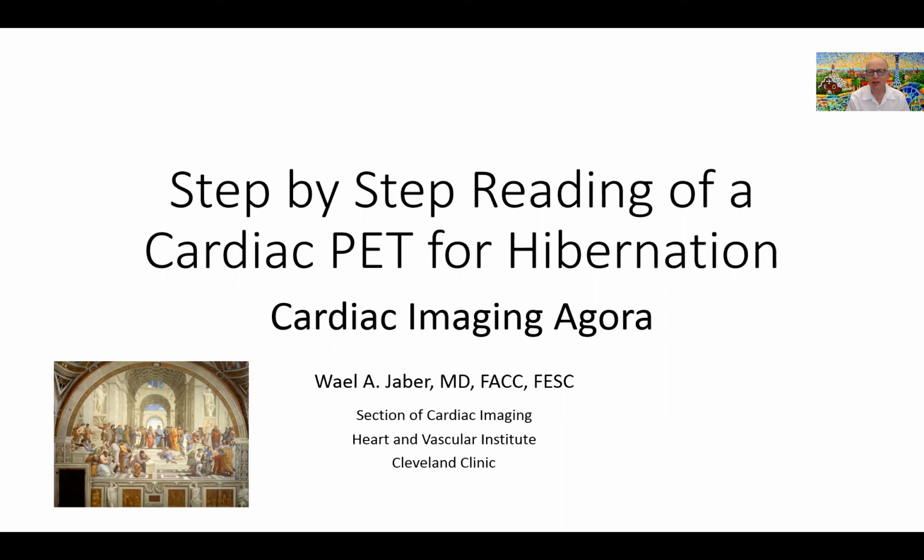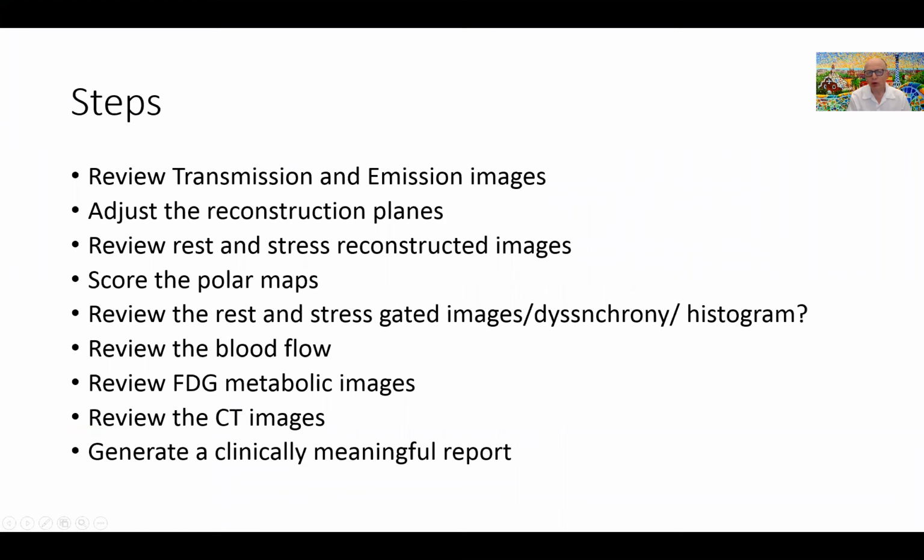In this session, we will tackle the issue of identifying hibernation on cardiac PET. We will go through the same steps we use in every reading session, except that this time, after we get to the point of identifying perfusion defects or the lack of perfusion defects on the rest and stress images, we go on to review the FDG metabolic images.